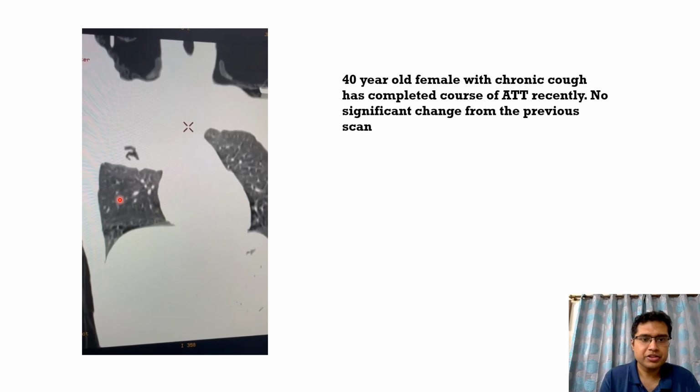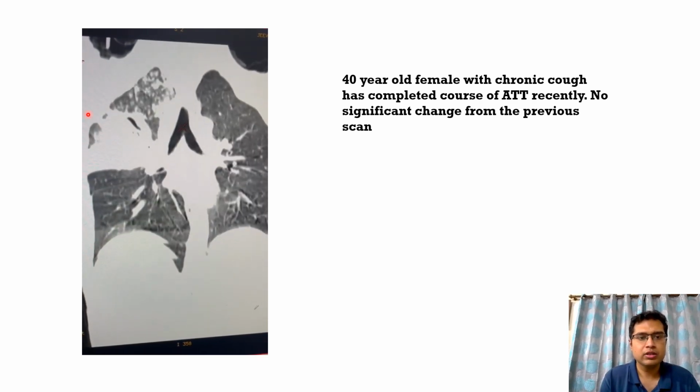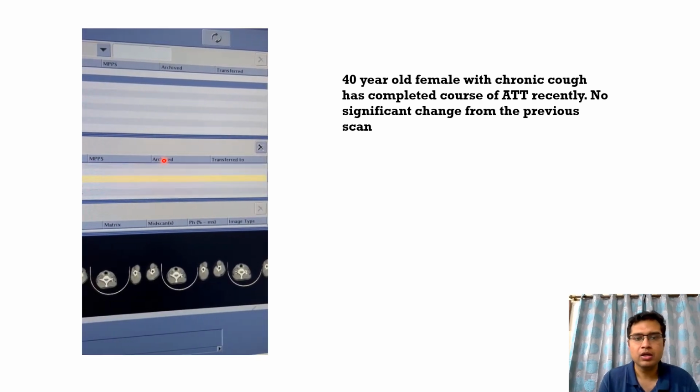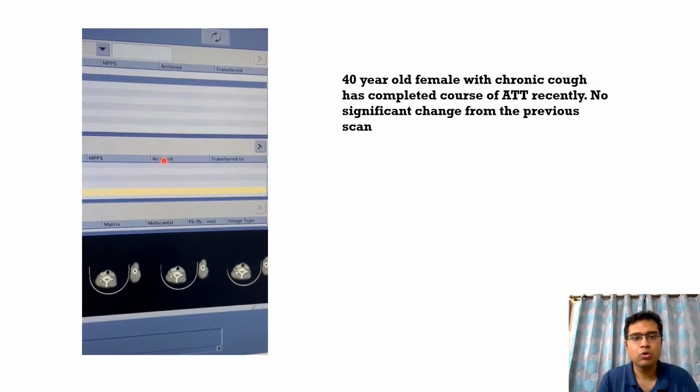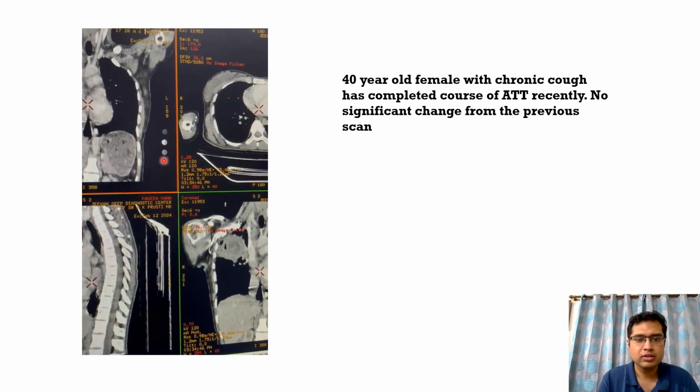This is the coronal section, lung window, where again we can see some air crescent along with multiple soft tissue density nodules in the right upper lobe of the lung. Let's have a better look at this lesion in the post-contrast sections.